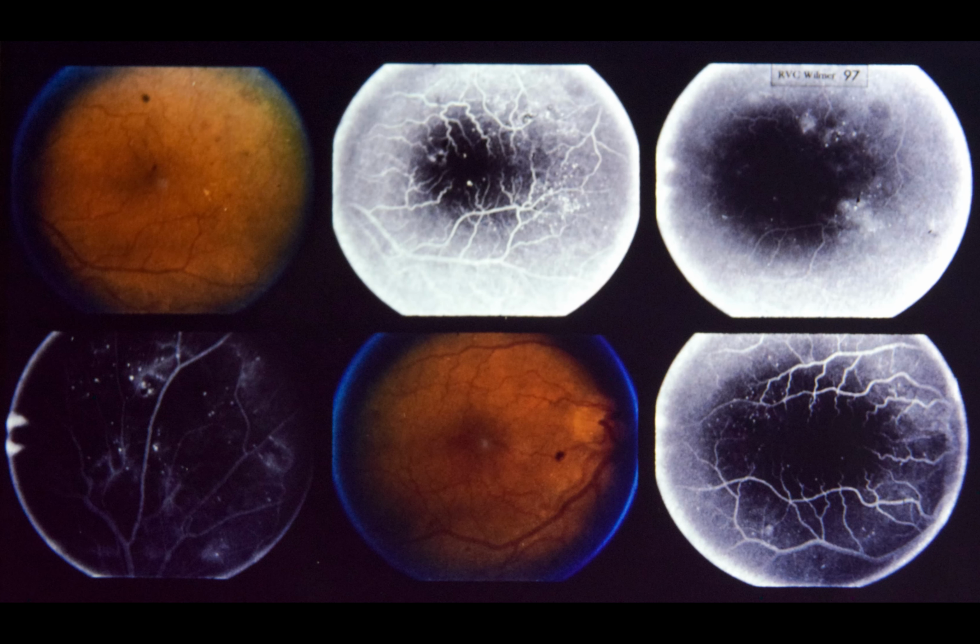Slide 97. Quiz slide number 3. This 58-year-old white male complained of metamorphopsia in both eyes. Despite symptoms, visual acuity could be corrected to 20/16 in each eye. The left macula is seen in the upper 3 photographs. Lower left is a fluorescein photograph superior to the left disc. Lower center and lower right are photographs of the right macula.